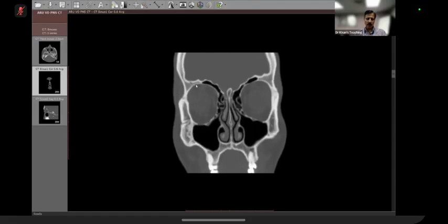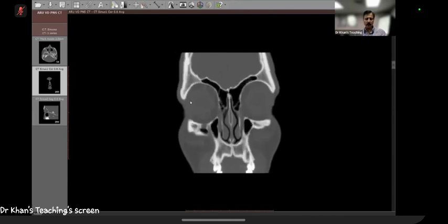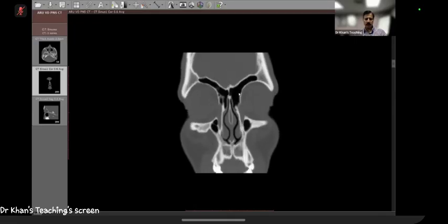So here is the frontal bone, and there is a suture here, the frontozygomatic suture. The frontozygomatic suture is an exam suture, and they will show you cases of trauma. And there is a concept of Le Fort injuries, where this is the lateral wall of the orbit and this is the medial wall of the orbit. I'll show you a few cases later on, and you have to tell the examiner if the fracture is going through it or if the lateral wall is also fractured or not. So this is the frontal bone, and within the frontal bone is the frontal sinus.